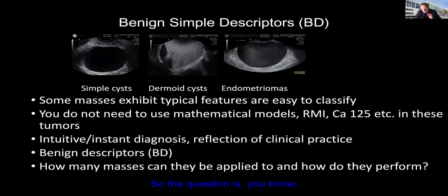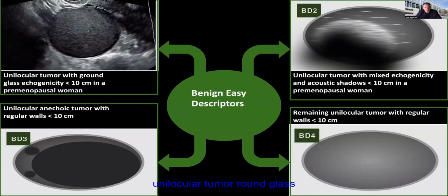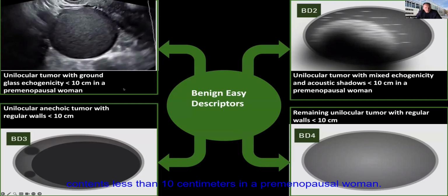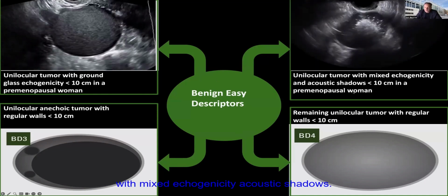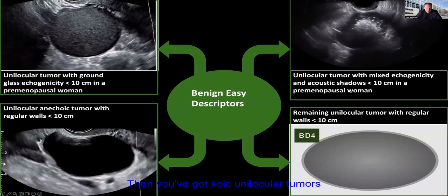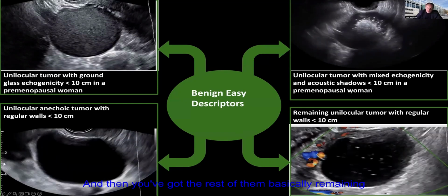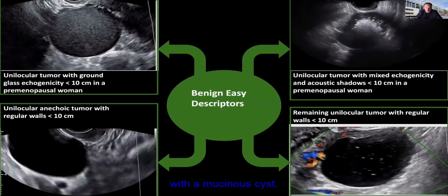So the question is, how many masses can they be applied to? Well, what are they and how do they perform? There are four. First of all, unilocular tumor, ground glass contents, less than 10 centimeters in a premenopausal woman. Typically for an endometrioma, unilocular with mixed echogenicity, acoustic shadows, which you can see coming out here, less than 10 centimeters, again in a premenopausal woman. Pretty obviously, that's looking at dermoids. Then you've got anechoic unilocular tumors less than 10 centimeters, and then the rest of them basically remaining: unilocular tumors with regular walls less than 10 centimeters, which you might see, for example, with a mucinous cyst.